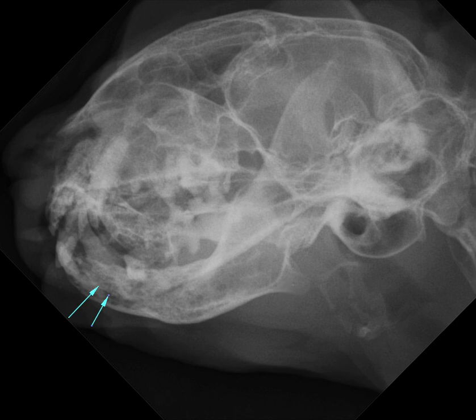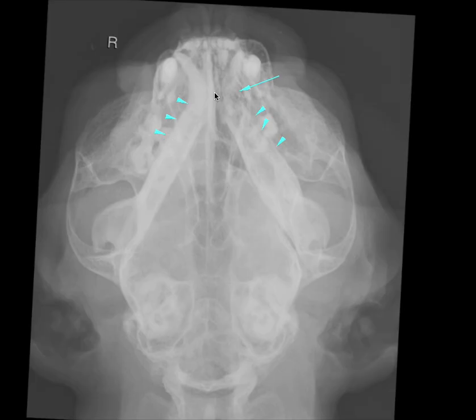So, my conclusion on this case is that I'm questioning increased radiographic opacity in the region of the right nasal cavity, and I'm questioning decreased opacity and disruption of the left rostral mandible. Differentials for this, as I said, could be non-specific rhinitis and possibly a process such as osteomyelitis involving the tooth root. Be sure to review the full report associated with this case.